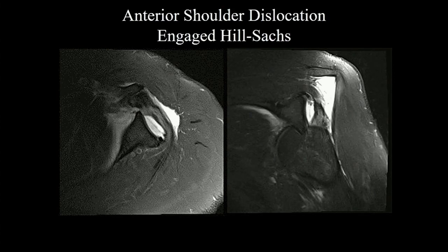Just to show you some companion cases, here's a patient who is actively dislocated within the MRI scanner. This is highly uncommon. These are patients who, for whatever reason, cannot be reduced within orthopedics. They've sedated them, they're having difficulty. They want to know what exactly is the damage before they reduce and likely create an additional fracture in these difficult reductions.